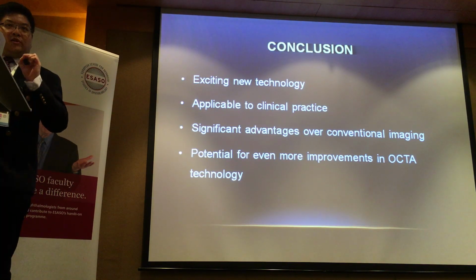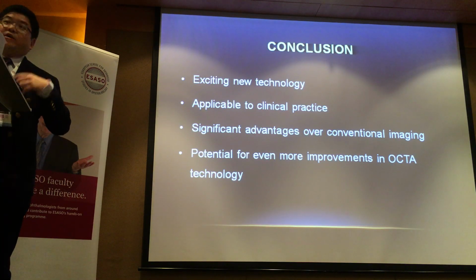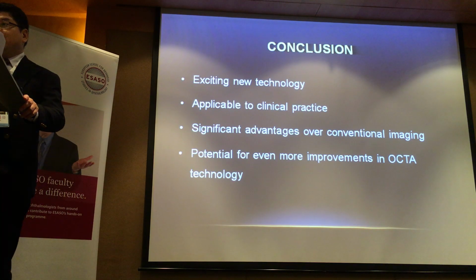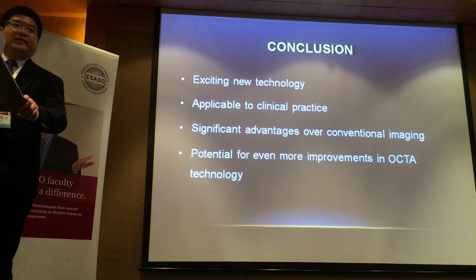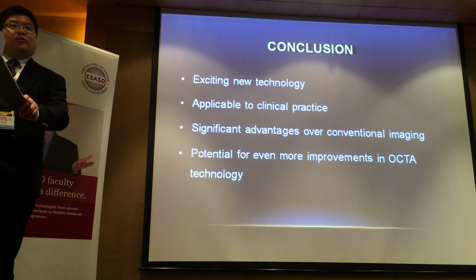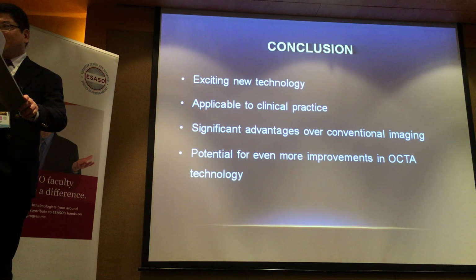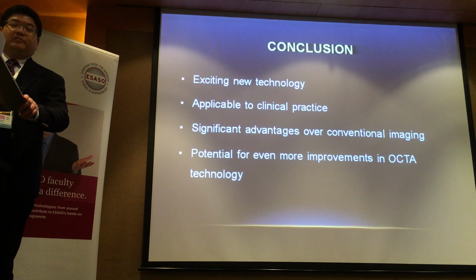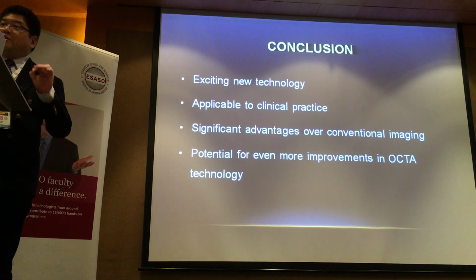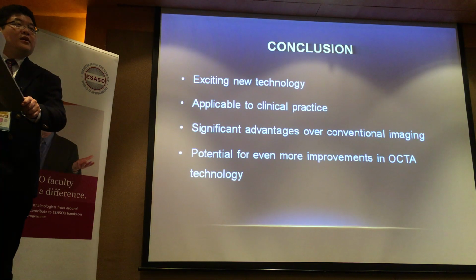So one of my colleagues showed me a case. Patient had diabetic retinopathy. The question was, is there sufficient ischemia to warrant a PRP? But the patient was ill and could not have a fluorescein angiogram. So they did an OCT-Angio and showed someone else who was actually a retinal specialist. I'm not saying this to put anyone down, but I'm just going to show you what I mean, how we have to be careful.